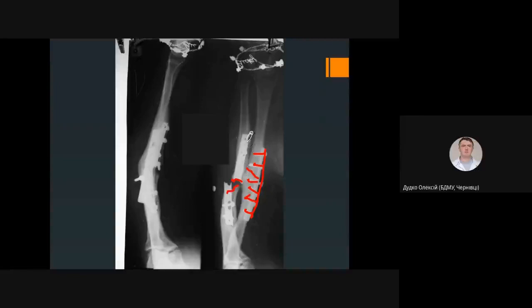We actually have a fracture of the metal device, the plate, which consists of two pieces now. If you see on the lateral view, you will note that the axis of the extremity is wrong. So we have some angulation that is not suitable for further function and should be corrected.